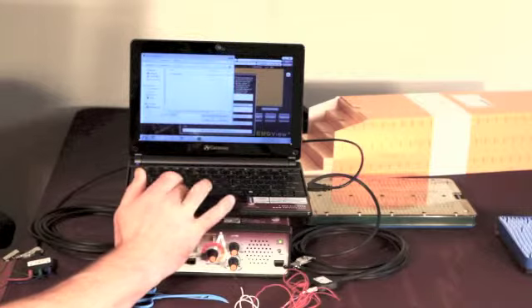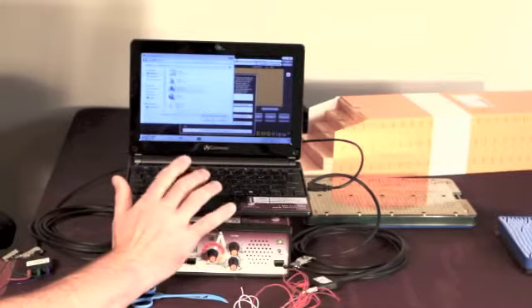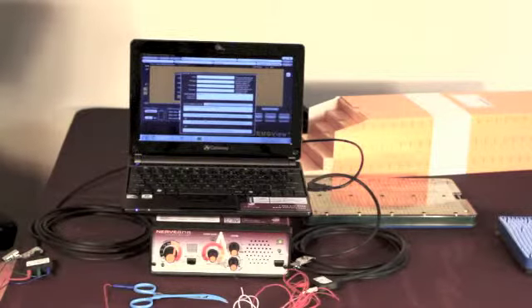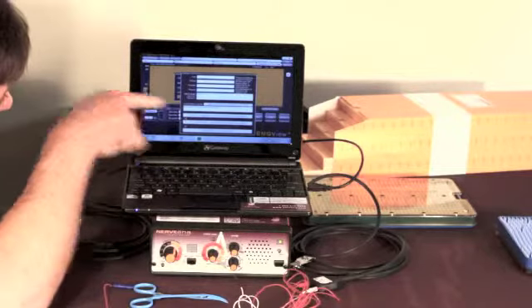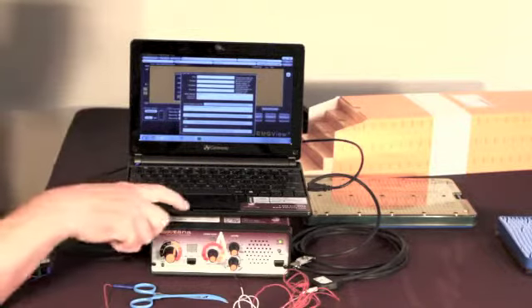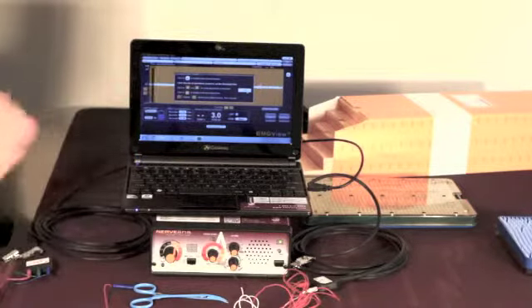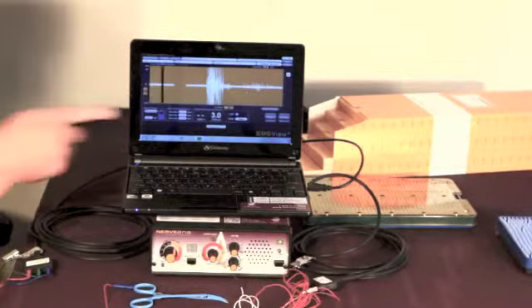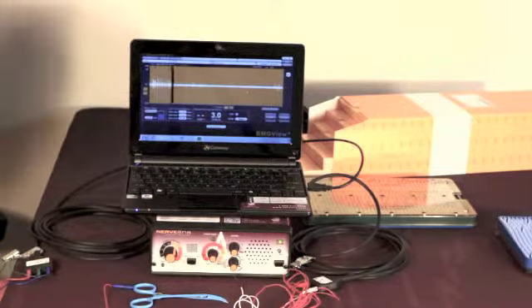So this is your typical Windows Explorer system here, and I have a folder called EMGView that I'm going to choose on my desktop to save my file here that we're going to record. So now I'm going to click the Start Case, Saves Above, and Start Saving Playback Data in the file named above. So here we go. And there's a little window that describes some of the controls when you first start up that you can close.